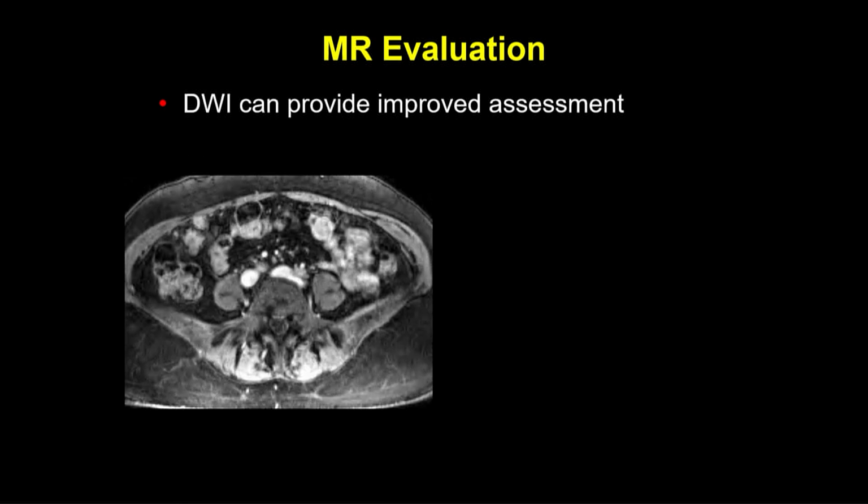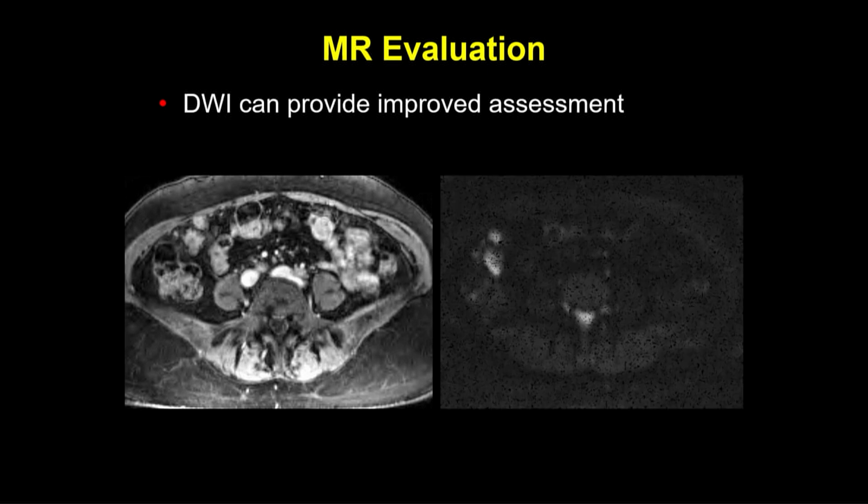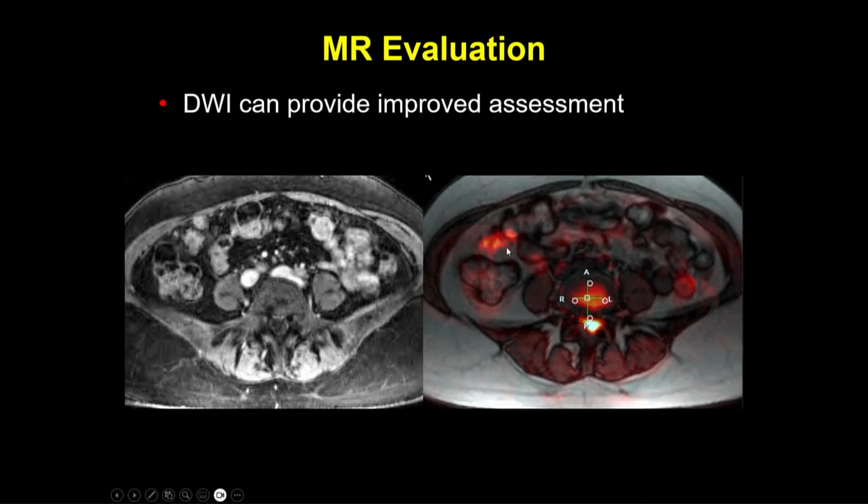I actually don't think it's a workhorse modality. There's a case from Sanjeev, actually, from Mallinckrodt. This is a patient with colorectal cancer. They missed these implants, but these were restricting, and you can even do some fusion imaging if you want with the diffusion and anatomic scans, and maybe not miss that these are actual implants.